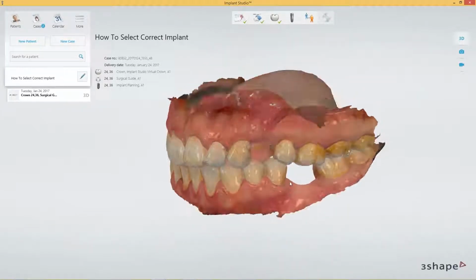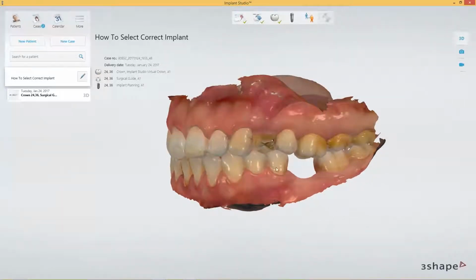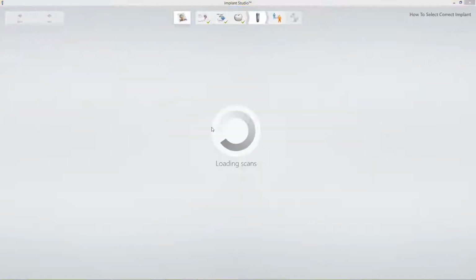But as we see on the teeth, here actually implants could be the first choice. And because we are talking about that, let's focus on that. Otherwise, this webinar would be really short. Yeah. So if I open up this case, I have prepared it.